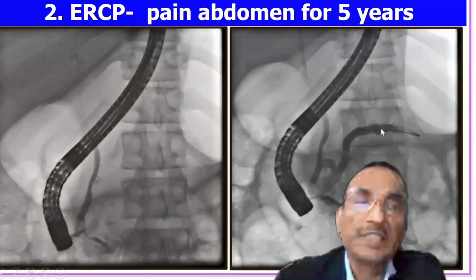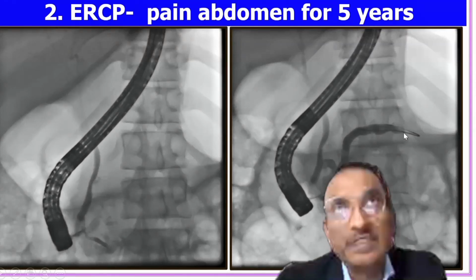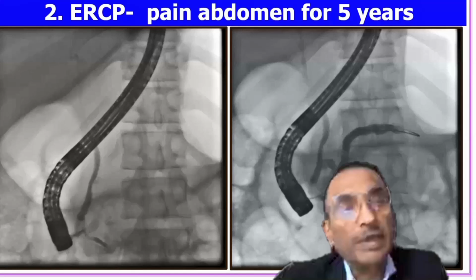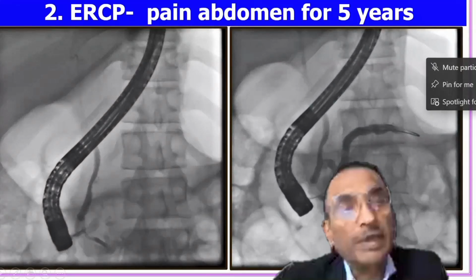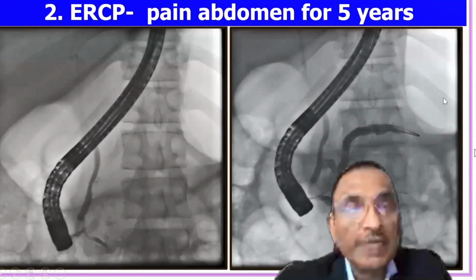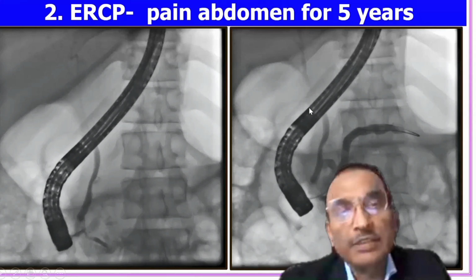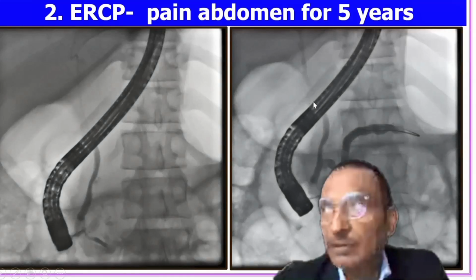So when you interpret a pancreatogram, you interpret based on the diameter. All of you remember the diameter of the main pancreatic duct is 3 millimeters in the head, 2 millimeters in the body, and 1 millimeter in the tail region. So you should remember. Here you don't see a scale because this has been cropped, but you will always have a scale by the side in digital radiology. Anything can be magnified or reduced in size, so otherwise you have an internal reference always, because this scope serves as an internal reference. The scope diameter is taken as 12 millimeters because most scopes are 11.5 to 12.5 millimeters.